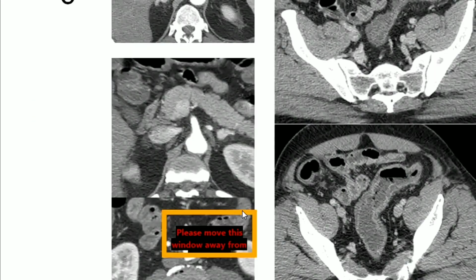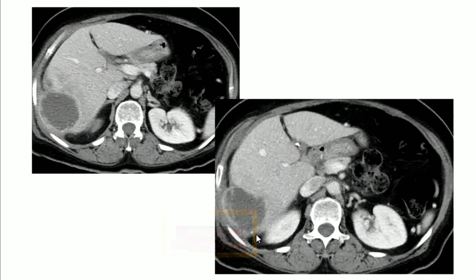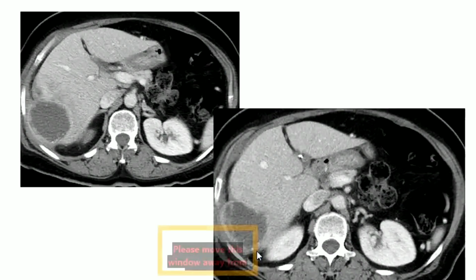These are CT scan axial images at the level of the liver, IV contrast enhanced. Here I can see that it is in the portal venous phase. I can see a hypodense lesion in the right lobe of the liver that shows peripheral enhancement, and a few internal septations which are also showing enhancement, and a few other enhancing nodular components as well.